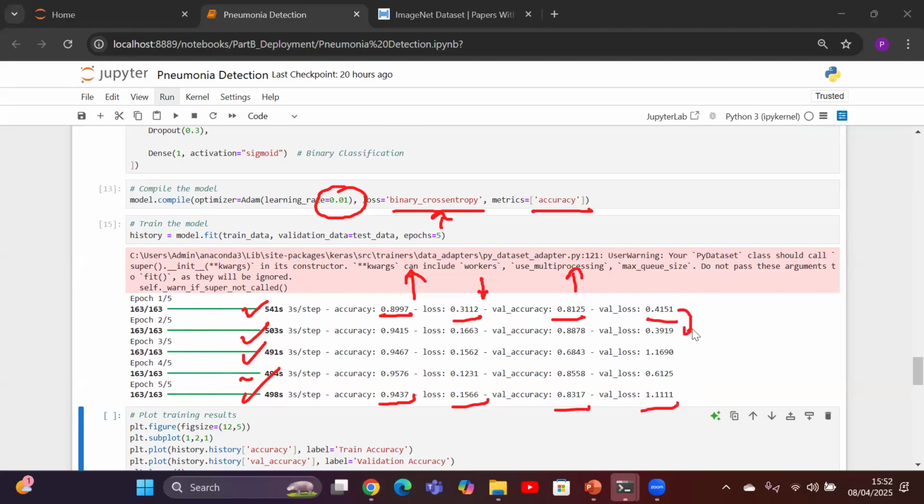I can see here it decreases, then again increases, then again increases. There is some problem with the data. Very simple. So this is the kind of interpretation we have to give in terms of model training. We can't say which model will work better with what data. It's all about train and test, or simply, trial and error.